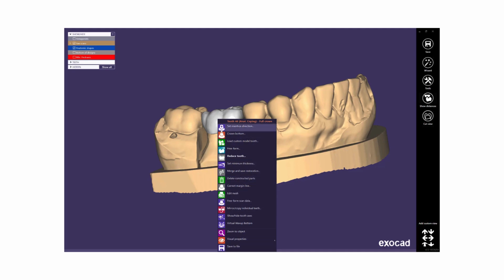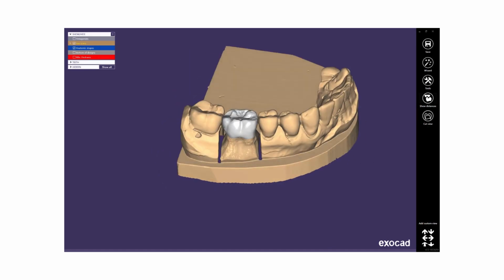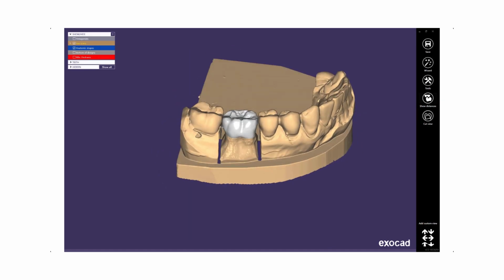So here our options, don't worry about them, are pretty easy, and we will talk about them later in different types of projects, because it depends on the project you are making, and here you will have more or fewer options. Okay, so for this video it's pretty much everything. It's just a fast review.